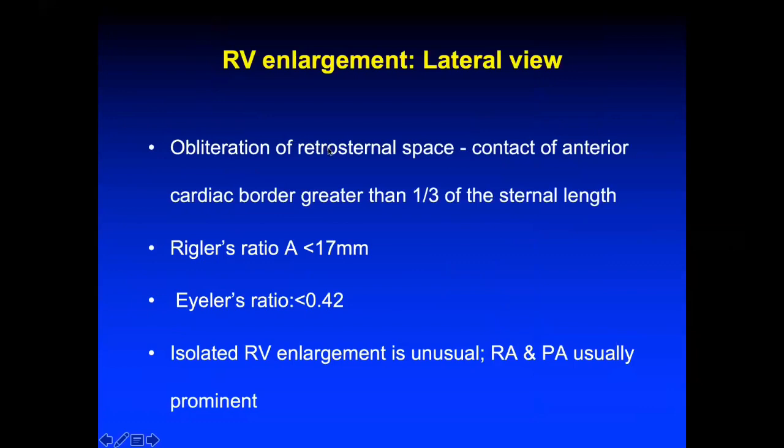RV enlargement on lateral view, this is the most important question the examiner asks you. How do you see a lateral view? Because obviously these days we are never tuned to see a lateral view X-ray, and the examiners know this. So they'll ask you about the obliteration of the retrosternal space.